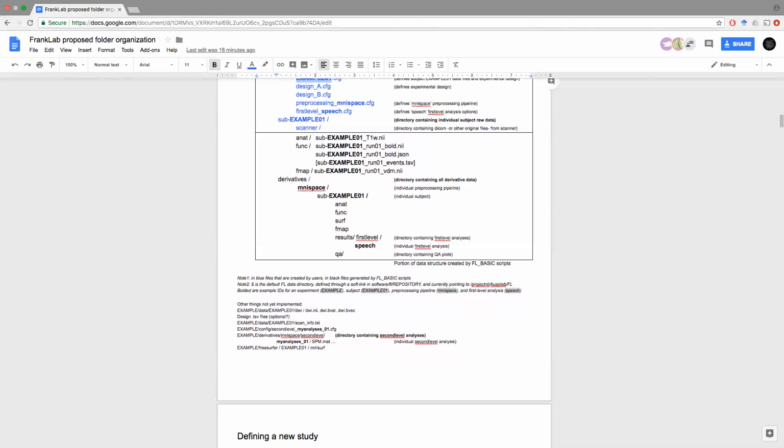Let me just flip this a bit and ask, so let's say you wanted to do surface-based analysis for cortical regions, and then volume-based analysis for subcortical regions. If you were to just point to, say, the same volume here, that could be the T1 volume, or maybe if we found that if you used something that was more closely tied to the original volume, like the orig.mgz or orig.nii that FreeSurfer generates, could you use that same one for both pipelines? Yes, definitely.